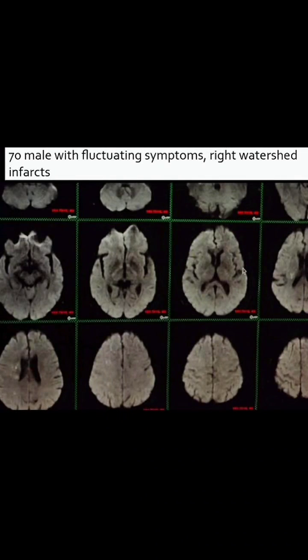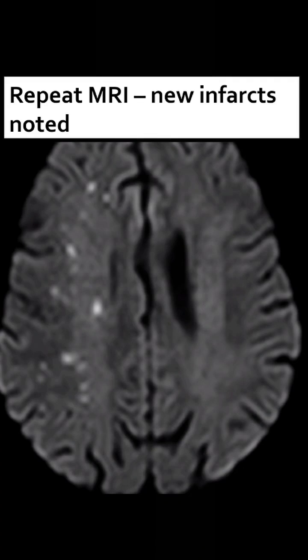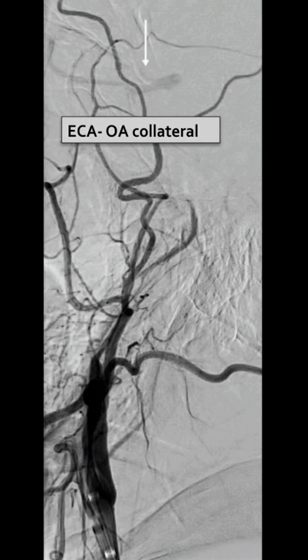This elderly gentleman had recurrent and fluctuating left-sided symptoms. Though his power was normal on arrival, he had weakness involving the left lower limb with a power of 3/5 and neglect. The left ICA injection showed ACA leptomeningeal collaterals to the right MCA territory and ECA ophthalmic artery collateral.